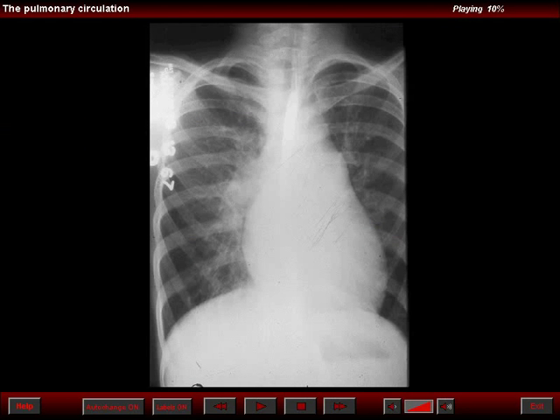This is the frontal view of the chest of an adolescent who had a septate left atrium. Note the prominent pulmonary artery segment, the enlarged hila, the prominent vasculature, particularly in the upper zones. However, the patient did not have a large left atrium, and clinically did not have the murmur and echocardiographic evidence of mitral valvular disease.